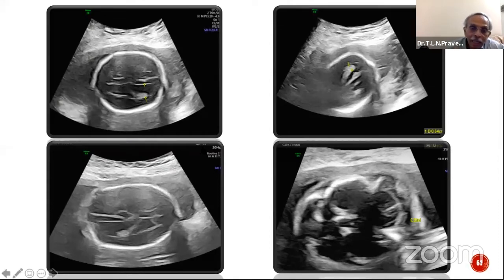So whenever we see these cases, particularly an open spinal defect, it is incomplete if you don't evaluate the cranium. The cranial features are extremely important, because there is an associated Arnold-Chiari 2 malformation, where you have ventriculomegaly, the lemon sign, as well as the banana sign, all of which were defined by Nicolaides way back, which are the indirect signs of open spinal neural tube defects.